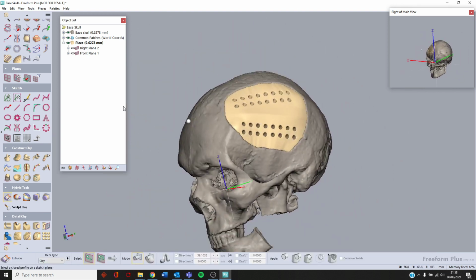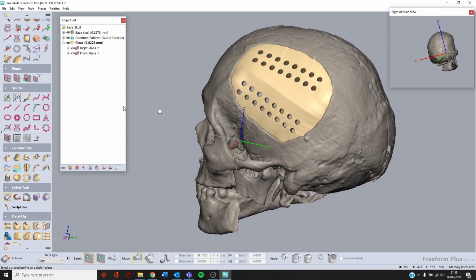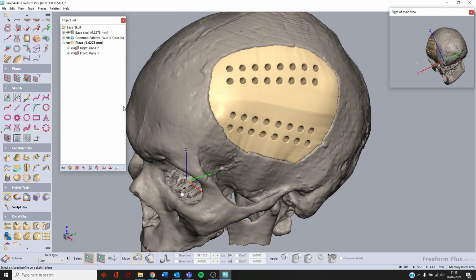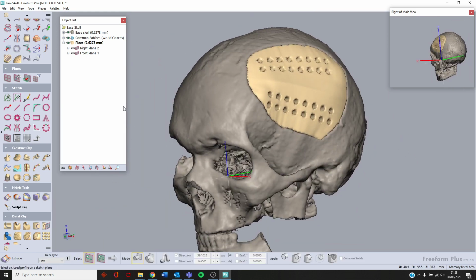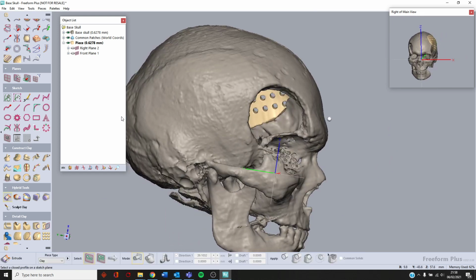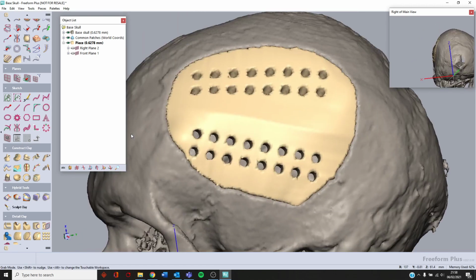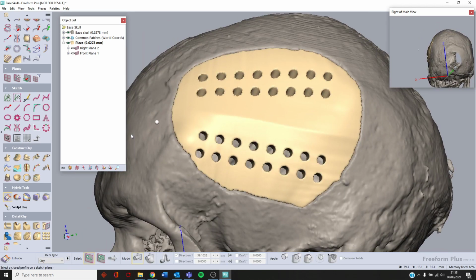That's our design. So obviously, understand this is a quick and dirty method, but very quickly you can create something that's, I think, half decent, and with a little bit more time on your hands and a little bit more practice, then you can perfect this workflow to actually get whatever you want to do. What else can we add?